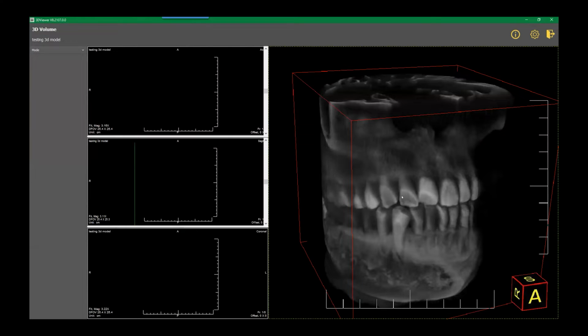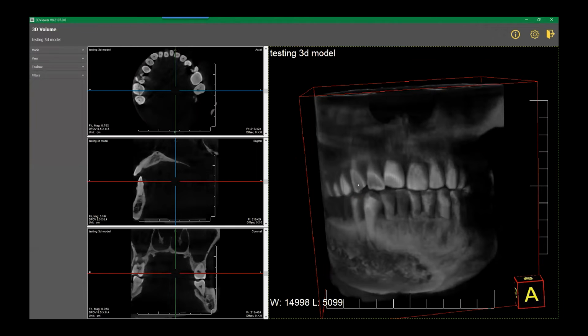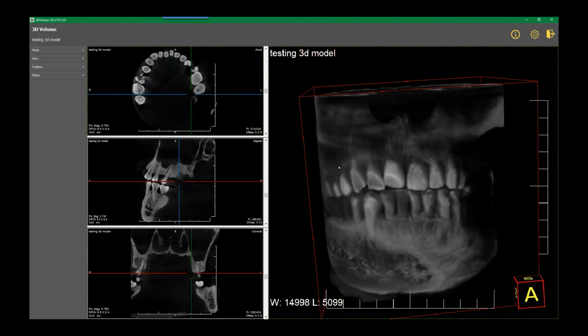That's okay. Now, one thing that is required on your side, doctor, is a good graphics card. Basically probably a separate video card that is 1 gigabyte or larger capacity to be able to view the 3D images correctly and quickly. Okay. Otherwise, it's going to lag, just so you know.